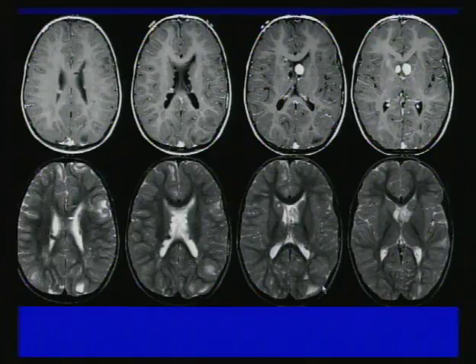And if you look at other regions of the brain, you see multifocal areas of abnormal high signal intensity in the gray matter and within the white matter, and on post-contrast images, we see these large enhancing lesions within the foramen of Monro. So with the constellation of findings, we know this patient has tuberous sclerosis, and these larger lesions at the foramen of Monro are likely giant cell astrocytomas. These can be followed. We just want to make sure the patient doesn't develop hydrocephalus, because these are low-grade lesions.